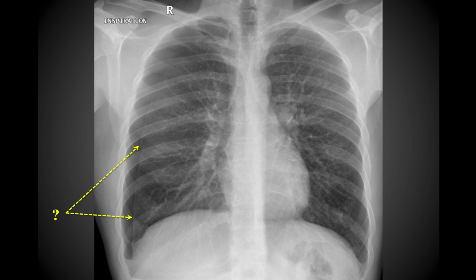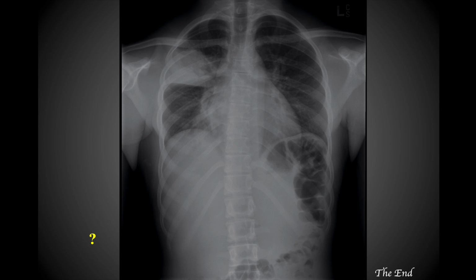And then another point is on this one, note that this is the visceral pleural line that you can see, and you can follow it all the way up on this image. You want to make sure that you don't confuse that with the medial border of the scapula. On this individual, based on their positioning, it's relatively difficult to identify the medial border of the scapula, but you just want to be aware. You can see even the horizontal fissure coming across right here, and then the pleural line continuing down. So you want to see a full continuous line if you're looking for the visceral pleural line. That's something to keep in mind when you're looking at x-rays.